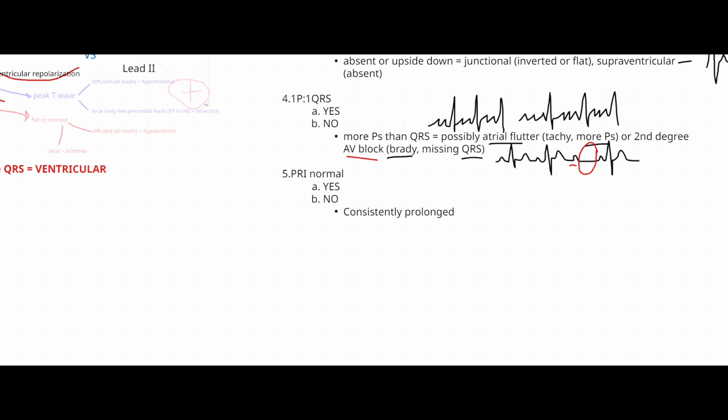So that is a first degree AV block. That is the only problem in the first degree AV block.